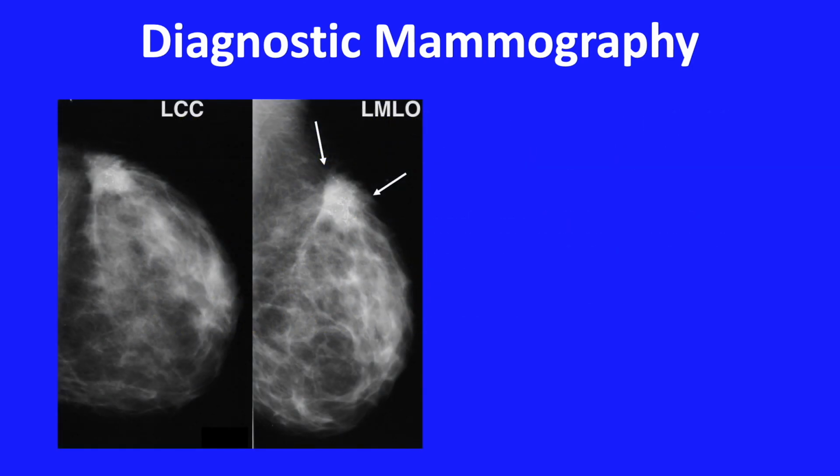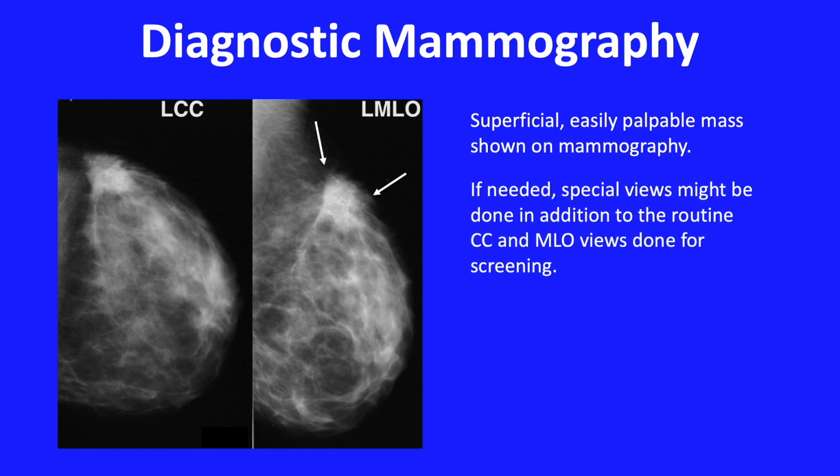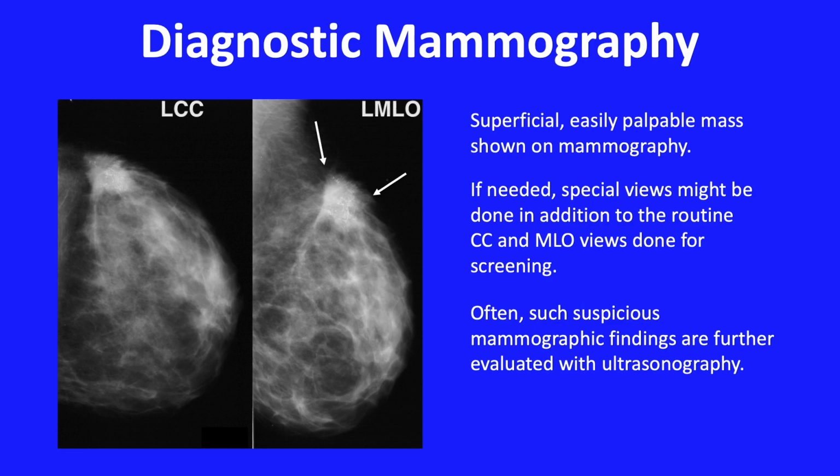Here's a classic example of a patient who had not been attending yearly screening mammography and presented with a large palpable mass. Based upon its mammographic and sonographic appearance, it was assigned a BI-RADS score of 4 and the patient was scheduled for ultrasound-guided biopsy.